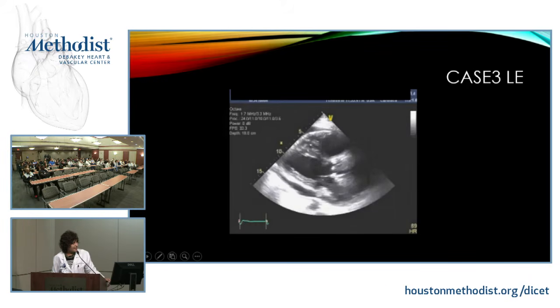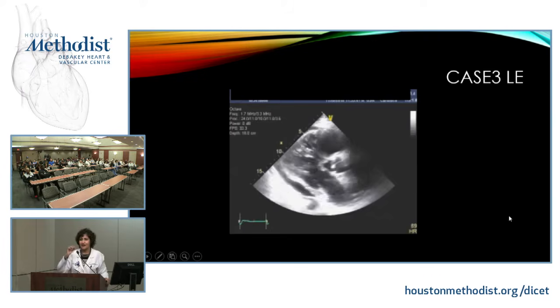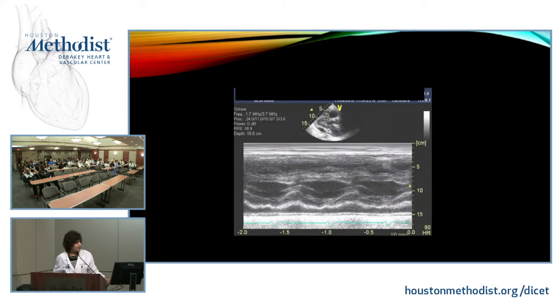One thing that catches you is this motion of the posterior lateral wall here. And again, as I mentioned, sometimes our eyes cannot pick that up because of the temporal resolution. You can feel there is a funny motion there. And if you were to slow it down and go frame by frame, you may be able to appreciate it better. So let's go to something that has higher temporal resolution, the M mode.